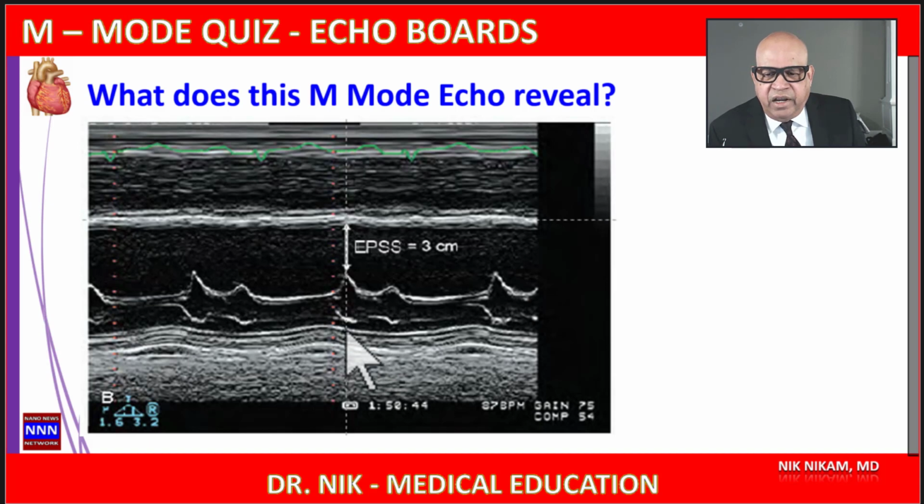So the left ventricle is moderately dilated, and along with that, the mitral valve E to F slope is quite separated from the septum as compared to some of the previous ones which we saw. The normal septal separation from the E point should be no more than 7 millimeters, but here it is 3 centimeters. Tells us that one, we are dealing with a patient with biventricular enlargement.